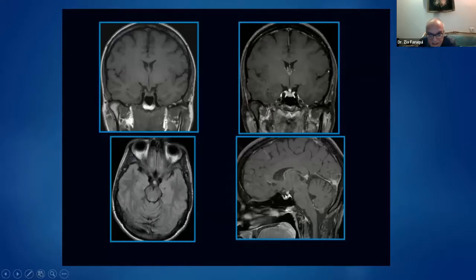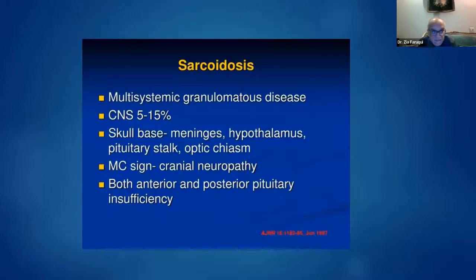And again, normal pituitary gland enhancing zigzag. But this is an important diagnosis in that if it's left untreated, it can lead to pituitary malfunction because of the destruction of the pathway between the hypothalamus and the pituitary. And if you treat it with steroids, it will respond very well. So just something to bear in mind looking at the appearances. Maybe it's important to raise the possibility to your clinicians.